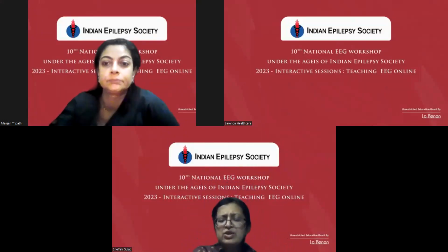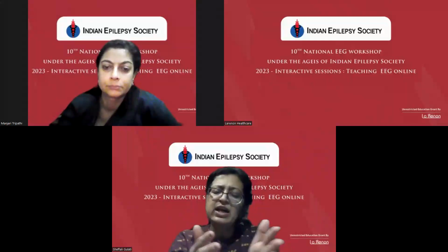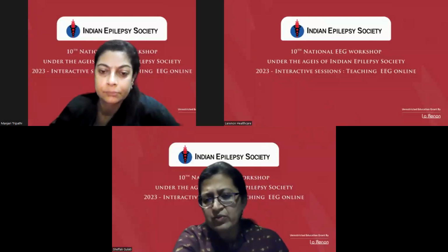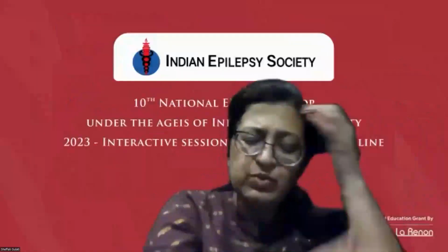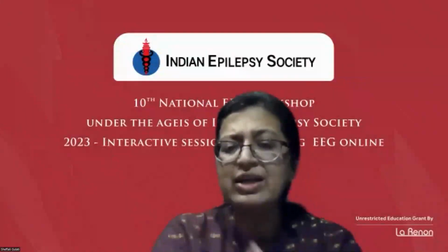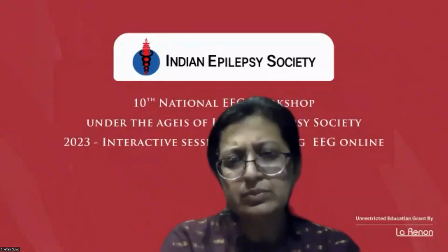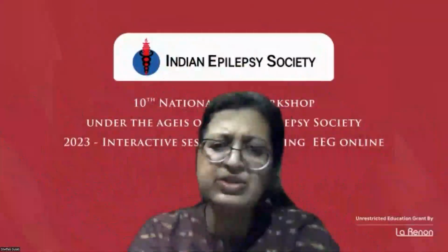See, once you have the Ohtahara, we understand all this early infantile DEE, what we have said, is going to evolve into West syndrome. We have seen in our cohorts, which we had published long back in the early 2000s, that they do evolve from EIE, which used to be called that at the time, now called EIDEE, going into developing West syndrome and LGS. So that is okay. Once you're getting a hypsarrhythmia variant, depending on the clinical picture, if the child has now started getting spasms, then you have hypsarrhythmia, and you can go ahead and call it West syndrome, because it is evolving. So there is a spectrum: EIDEE, West syndrome, going to LGS.